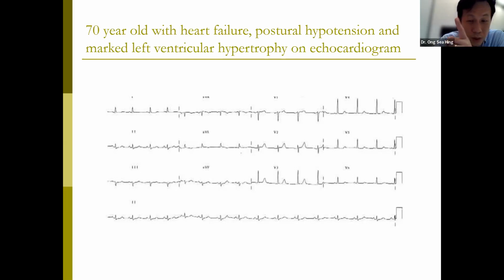Okay. One word on ventricular hypertrophy. You know that there are the Sokolow and the Cornell criteria. I won't go too much into this, but basically, if you take the S wave in V2 or V1 with the R wave in V6 or V5 and add up the boxes, if it is more than 7 big boxes, or 35 millimeters, then that is suspicious of left ventricular hypertrophy.